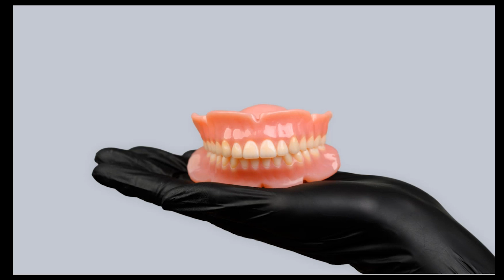Up to you. So after you have everything ready for shade assignment, you start applying the base shades. And here, when you want to apply the same base shade to a few dentures at the same time, just go to model settings, select the base, hold Control, and select however many models you want to apply the same base shade to, and then do the rest of the tray as usual.